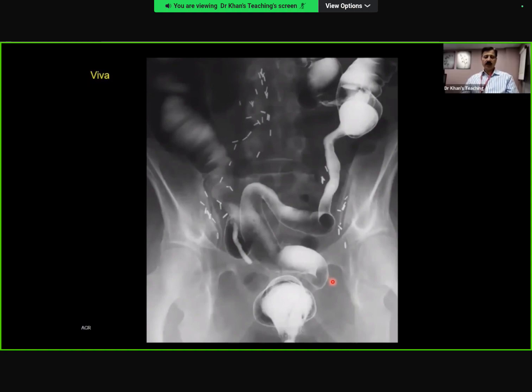Okay, fine. I'll take over. Okay, fine, good. This is a post-radiation stricture. Now, you have to again remember your pathology, and you can make your radiology from there. Basically, post-radiation changes are because of vasculitis. Small vessels of the gut will have inflammation. And this vasculitis will present acutely because there can be leaky capillaries as well as some hemorrhage, intramural hemorrhage, and there can be mucosal thickening, etc.